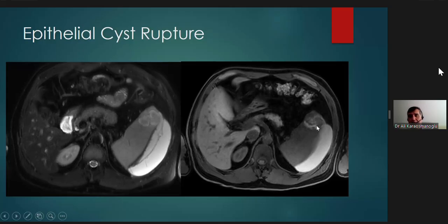So pre-contrast, there are some hyperintense areas, right, on the peripheral part of this mass and also inside this mass. And T1 hyperintensity here in the subcapsular hematoma is mostly suggestive of hemorrhagic elements. Post-contrast didn't reveal anything. So the patient underwent surgery because a malignant process could not be definitely ruled out based on imaging.